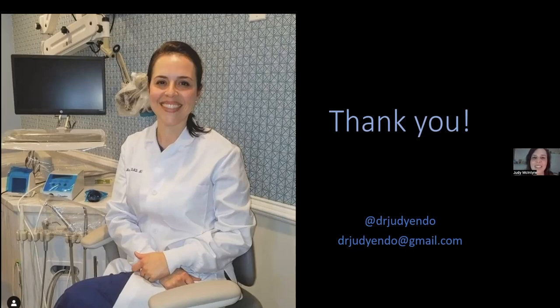Okay, do you know how to EPT on a crowned tooth? Ooh, great. Yes. If you have an electric pulp tester in your office, people will say, oh, I can't on this crowned tooth. So what I do is I take the wand, and I actually have a video of how to do it on my Instagram page, but I connect the EPT to an explorer. So the wand goes to the metal explorer, and then you try to find a spot near the CEJ where you're not touching the crown and you're not touching the gingiva, and that will conduct your EPT quite accurately.